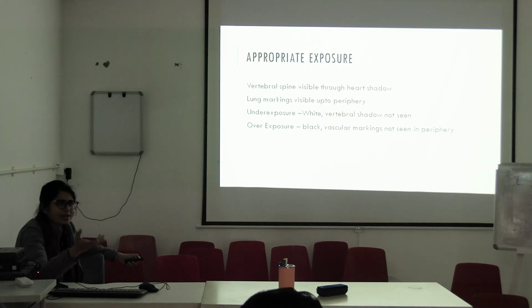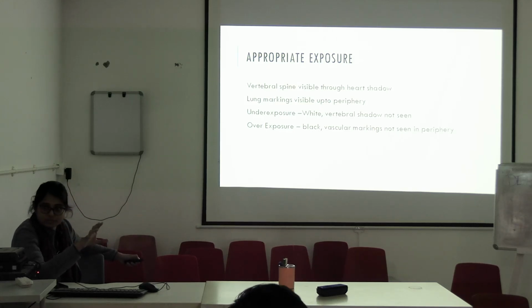But you can get black in pneumothorax also. You can get black in hyperinflation. But when you see that the structures are all okay but the film is more blackish, it means it is a bit overexposed, okay.